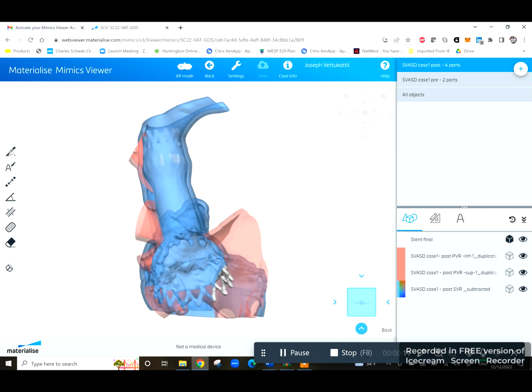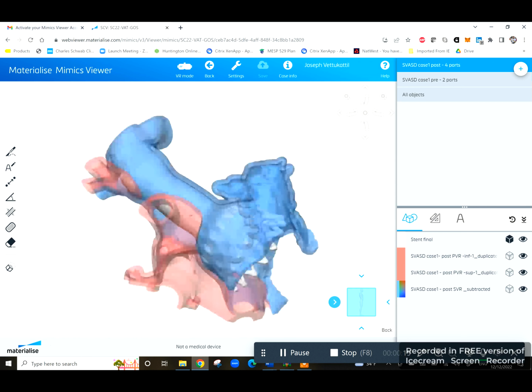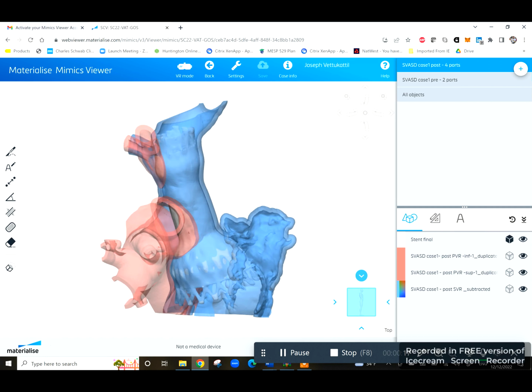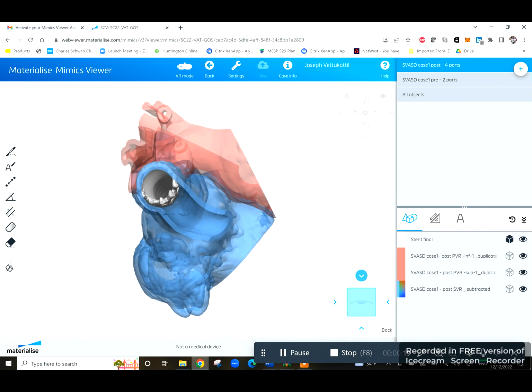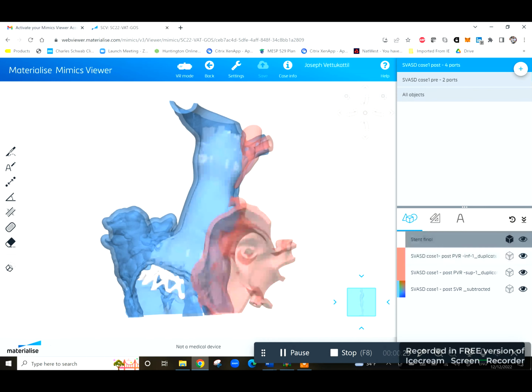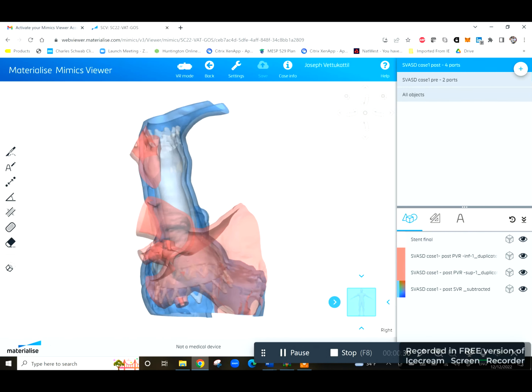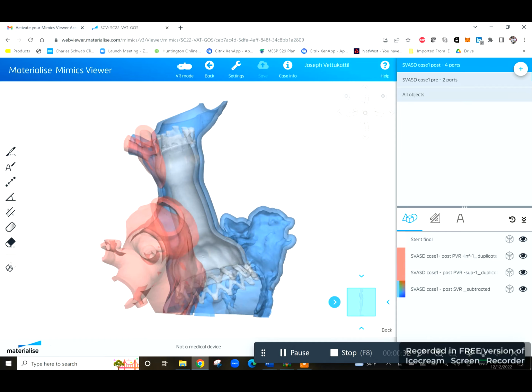In this illustration of virtually implanted device, one can appreciate the smooth flow of pulmonary veins directed to the left atrium using the VB stent. In some samples, closeness of the azygous vein in its proximity to the right superior pulmonary vein necessitates the need for occlusion of the azygous vein prior to the placement of the VB stent.